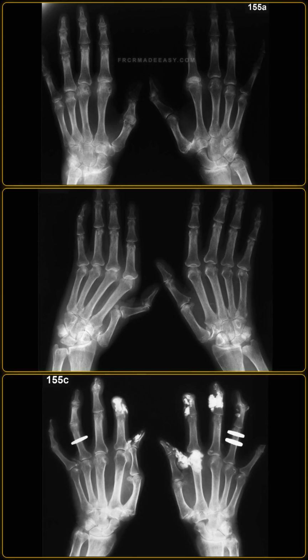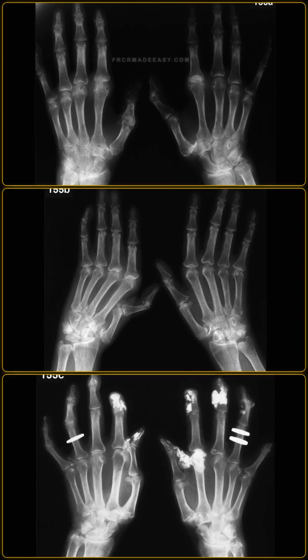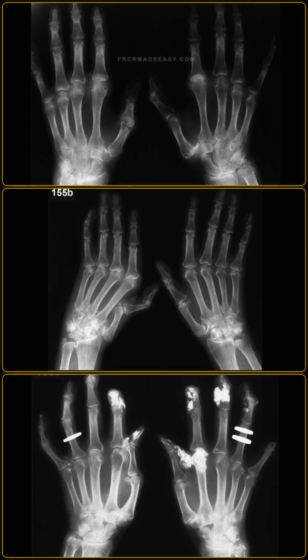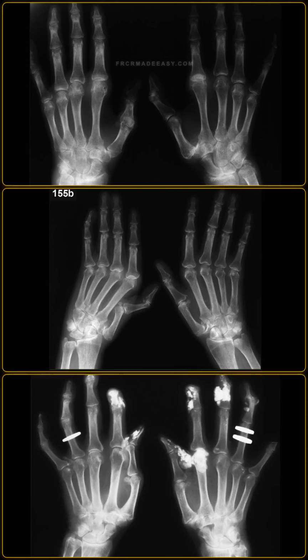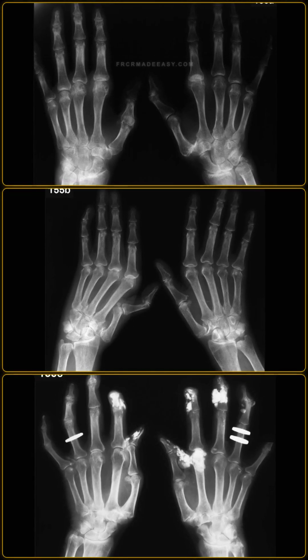I would also suggest a chest radiograph and echocardiography if the patient has cardiopulmonary symptoms, to evaluate for pleural effusions, pericardial effusions, or cardiomyopathy. I would communicate the deforming non-erosive arthropathy findings to the referring clinician and suggest a rheumatology referral for serological evaluation.